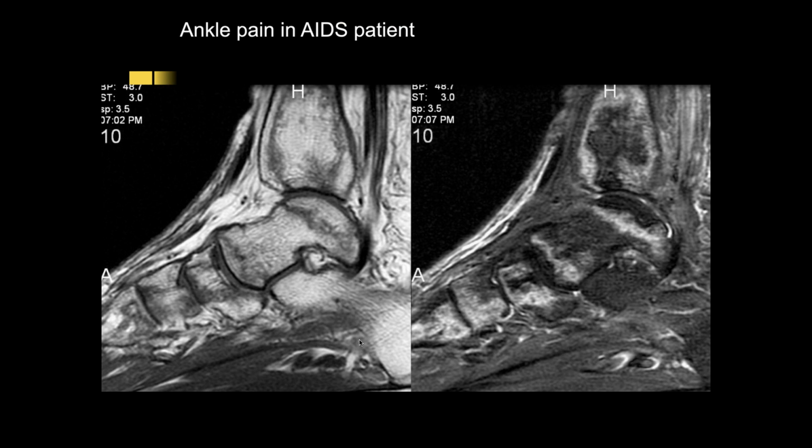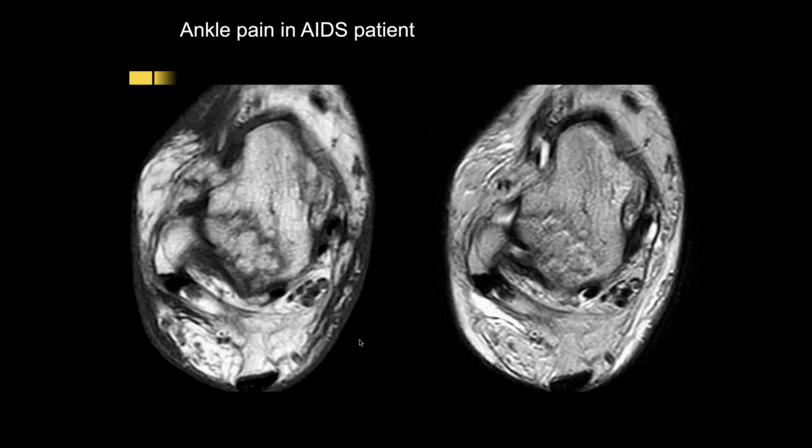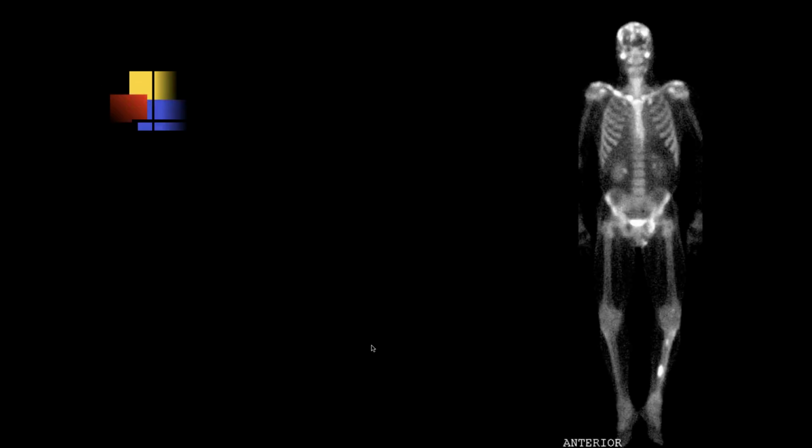Right. Yeah, so these are all bone infarcts. Good that you brought that up, Michael. Okay, Ashu. Okay. Bone scan. There seems to be uptake within the tibia on the left.